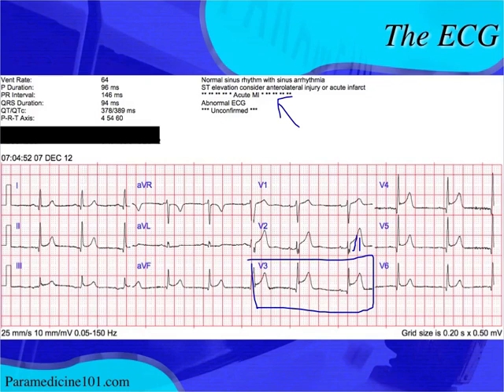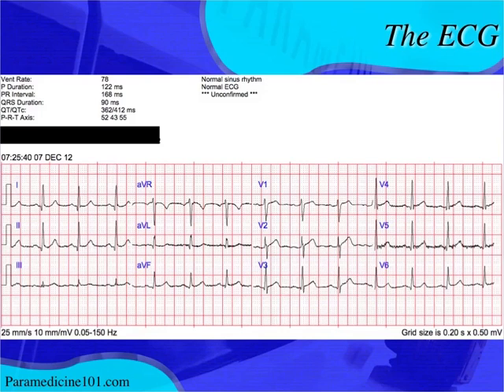Now, if you're worried and you're thinking, well, I don't want to call it a STEMI and activate an expensive cath team based on this 12 lead alone, because this 12 lead really does have a lot of indicators for acute pericarditis, that's fine. Just start your treatment regimen, give them aspirin, give them nitro, and then do consecutive 12 leads. And that's what this crew did. And here's the next 12 lead. The next 12 lead actually looks better than the first, but it's actually resolved pretty much all of the ST elevation, and it in fact says normal up here now.